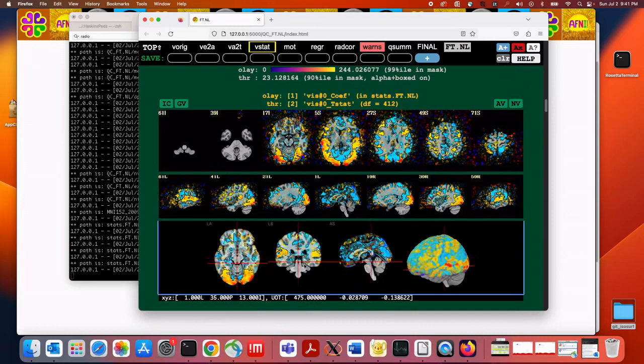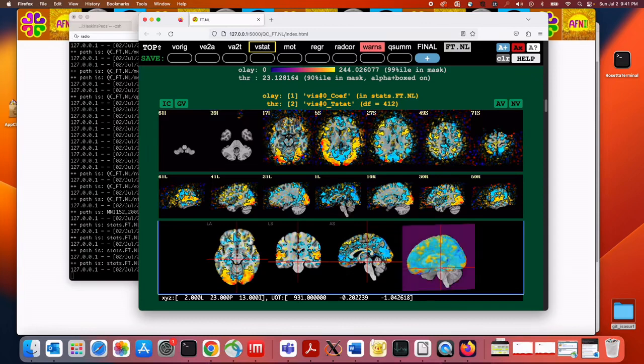It's an interactive viewer, so we're not limited to this fixed set of slices. We can see all the slices, and it's been set up to look something like the way AFNI looks too. But it does have this additional 3D rendering in here, and you can type C on there and scroll, and it will clip the planes.